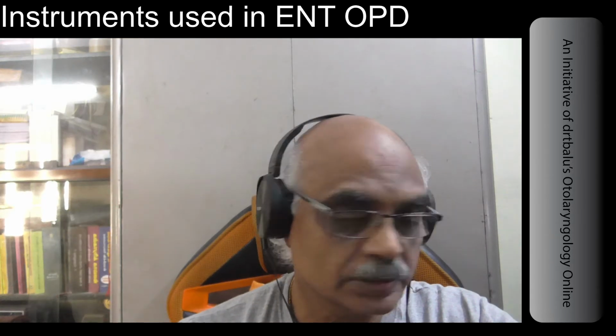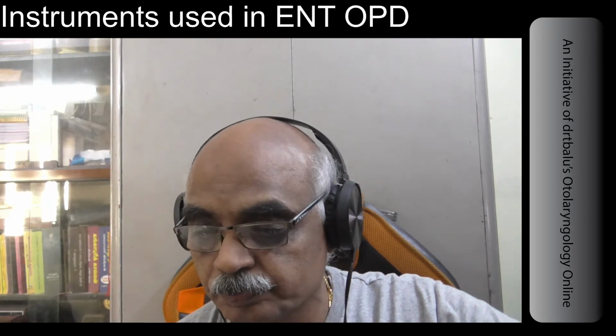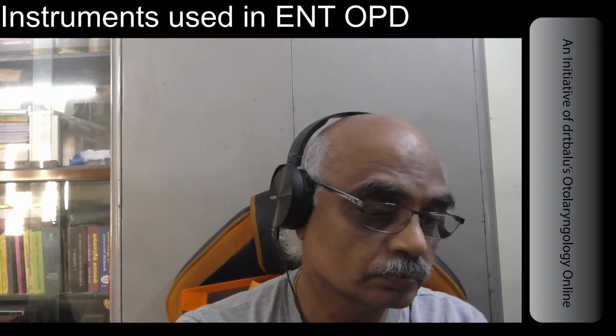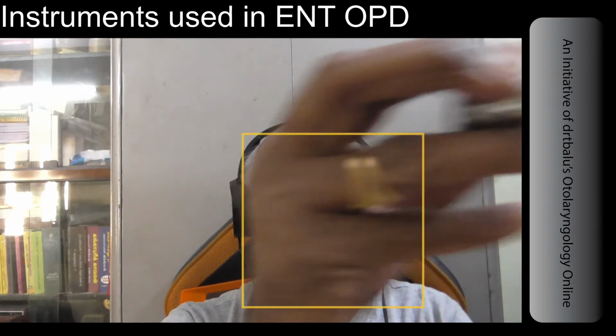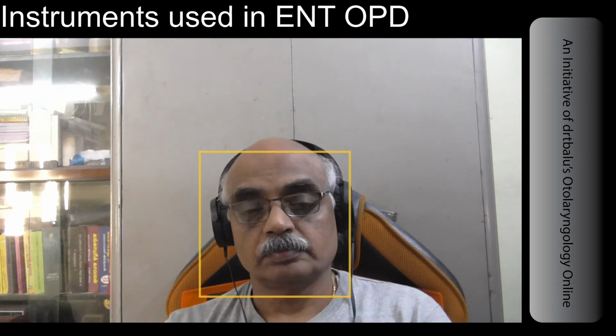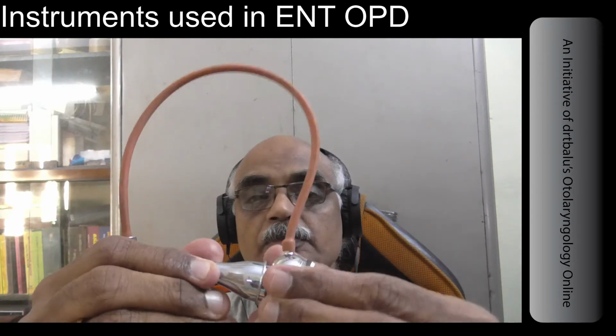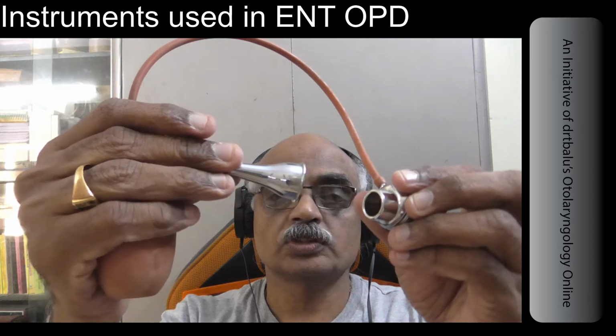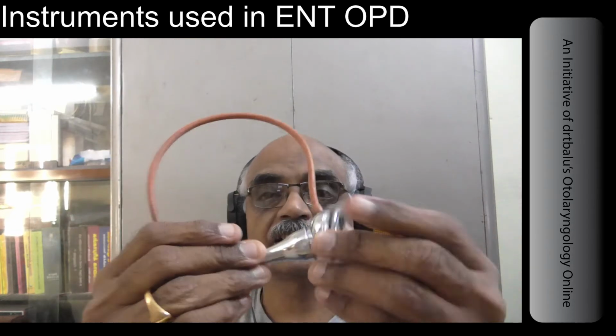The next instrument I am going to show you is Siegel's pneumatic otoscope. The components are an ear speculum, which is used to straighten the external auditory canal, attached to the eyepiece.